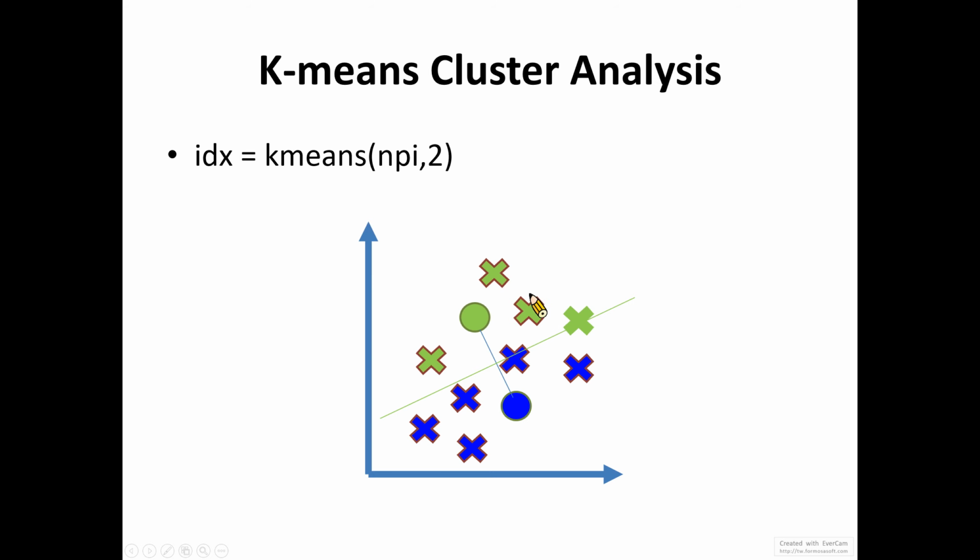So it is very important that we designate the number of clusters, because with the number of clusters we need to randomize the initial locations of the centroids in the data space. For example, if you designate k equals 2, that means we should expect the classification into 2 clusters.